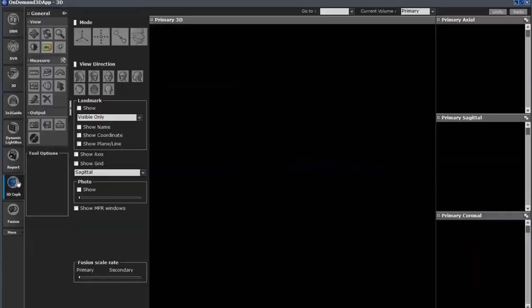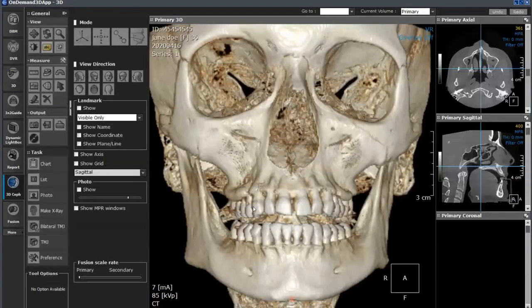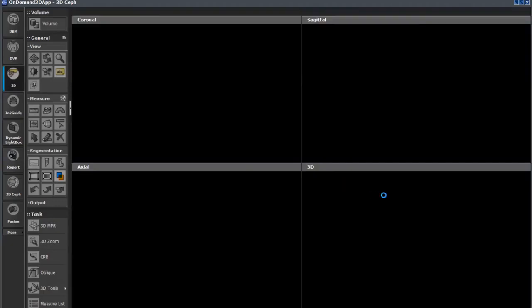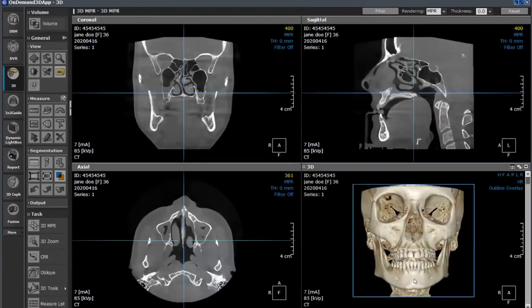As I said in another discussion, we'll talk about the fact that we can do 3D cephalometrics off of this. We can add a patient's photo to the skull itself. So now this becomes a great thing to discuss with your patients about their procedure and their CBCT, being able to have their personal image and then fade it out to their skull and then work into the 3D mode to actually walk through their images themselves.